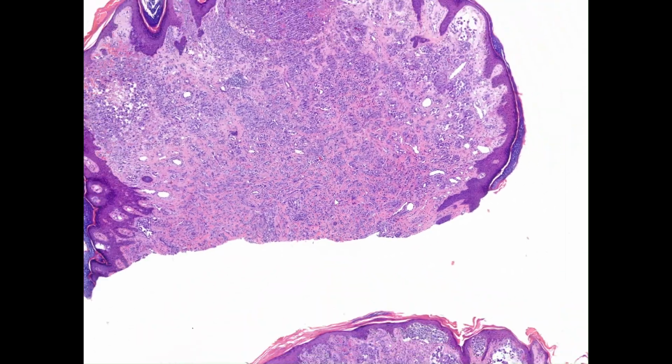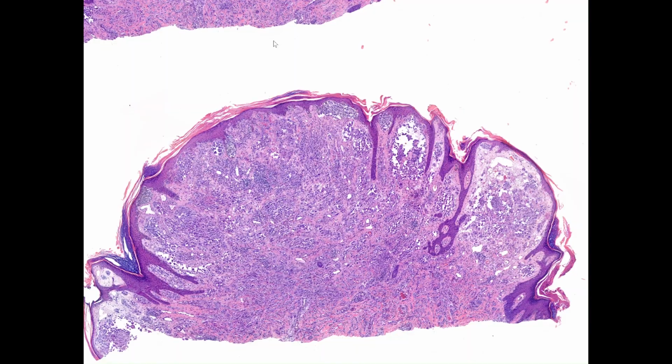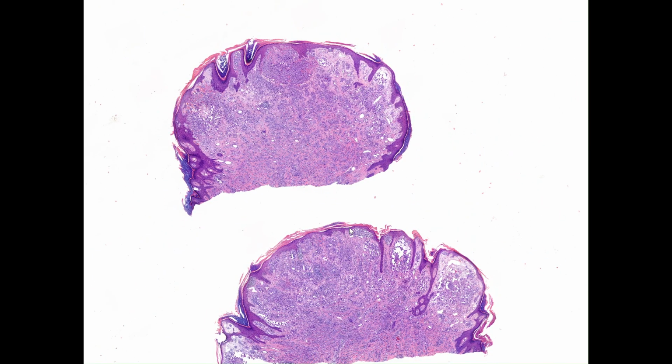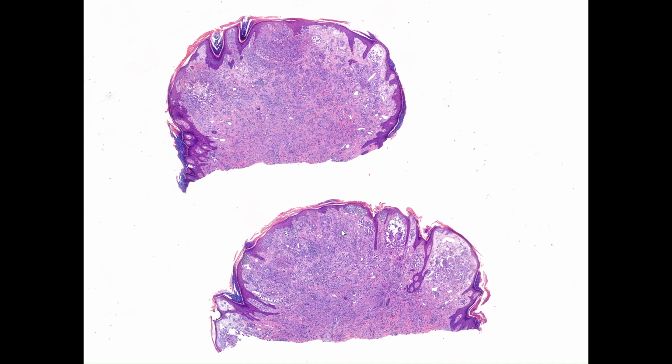Hi, everybody. One of my fun cases for the festival is going to be the diagnosis of Spitz melanocytoma with p16 expression loss. Thinking about how we make that diagnosis, what we look for, and what we can expect to see. This is a polypoid papule from a 7-year-old. Clinical diagnosis was angioma and shaved by a clinician and then evaluated by a contributor.